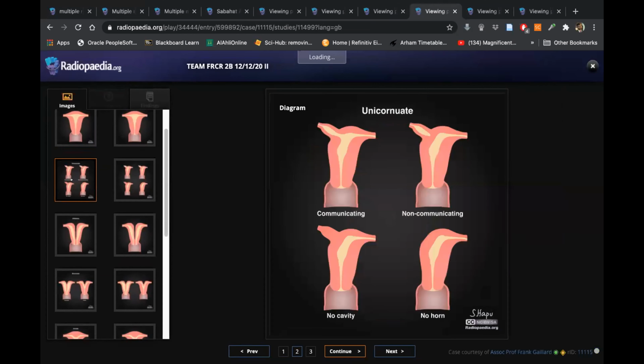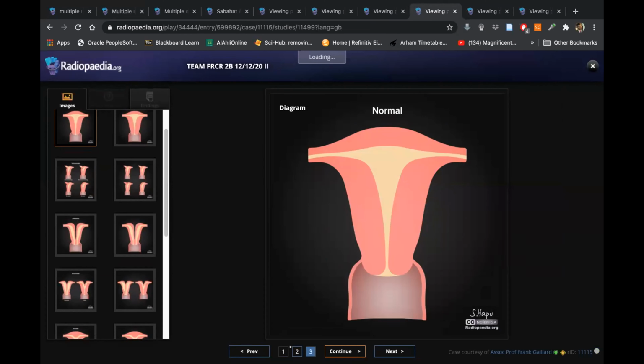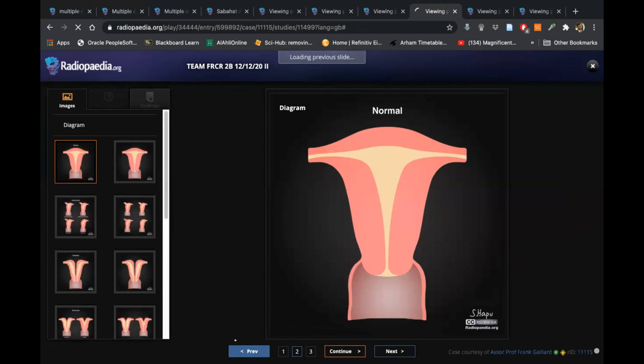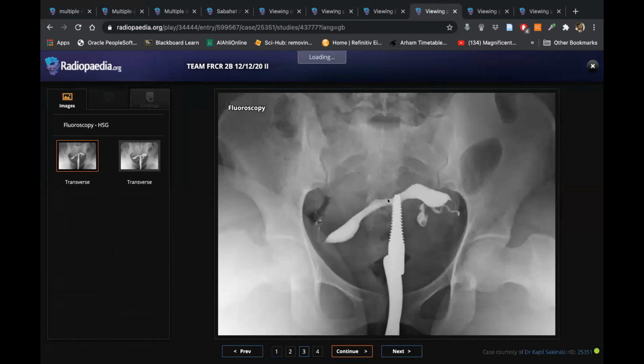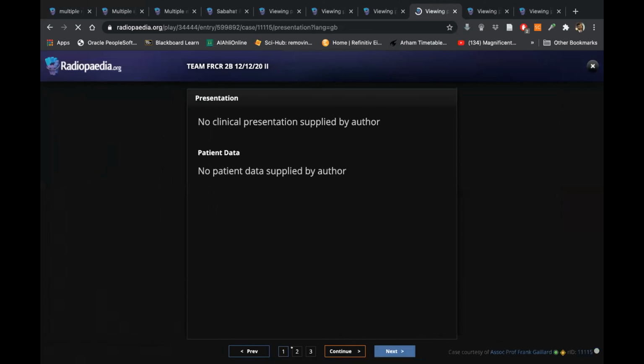But on what basis have they said that there are 2? Because I think they have done the case. I agree. It doesn't seem like 2 cervical canals, but maybe because they first cannulated 1 and then went for the second. It's very hard once you have cannulated; it's not always possible to see the cervical canal very clearly. But I think it's more when they did it, and maybe they have other phases which they have not given to us. That is my thinking. But let me show you more here.